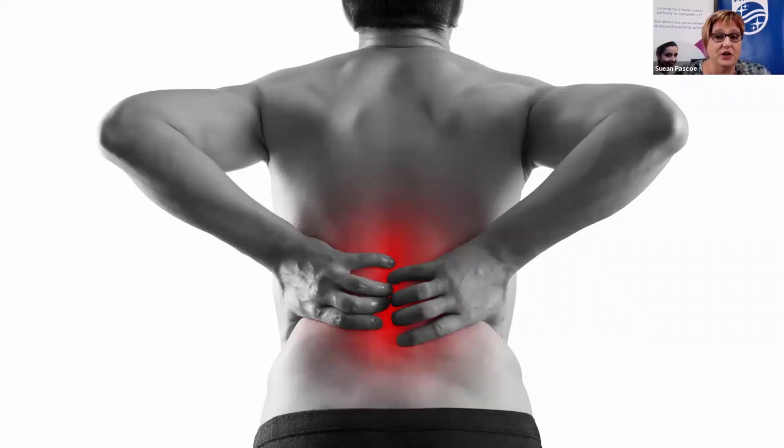Often the location of the stone can be anticipated based on your physical exam. Now, imaging patients with kidney stones facilitates their management because we can establish the size and the location of the stones. And so if we choose the right modality, we can get that process underway much quicker. And choosing that right modality involves many factors, which does include the clinical setting and the availability of various different imaging modalities. So if it's 3 o'clock in the morning and you don't have access to the CT, it's handy to have an ultrasound machine in your pocket.